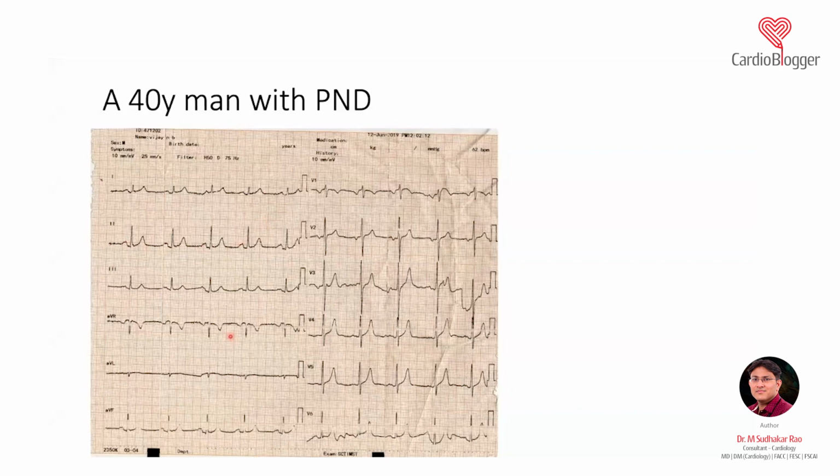The third and the fourth points are indices, called the Macruz index and the Morris index. The easier one is the Morris index. If you see here, there is no right atrial component, there is only a negative deflection. Again, this is a classic negative deflection. As I told you, is it a right atrial enlargement or pseudo left atrial enlargement due to right atrial enlargement? You see from the tip to the nadir, it is moving so slowly. So it is due to left atrial enlargement. If it was like this, it was a right atrial enlargement. If it is like this, it is a left atrial enlargement. And you see it is so deep and so broad.